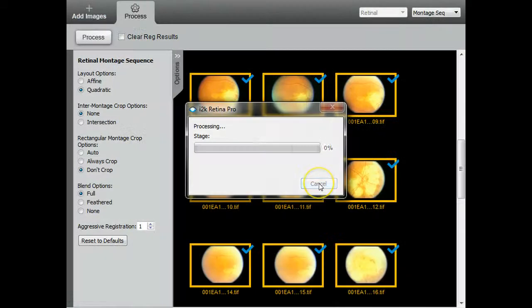Let's just say test. And now it's doing its usual work of estimating camera properties and correcting the illuminations on the images, picking the best seams in the images, and also mapping them to form mosaics. It's going to take a little bit of time because we are doing 5 mosaics at one time.